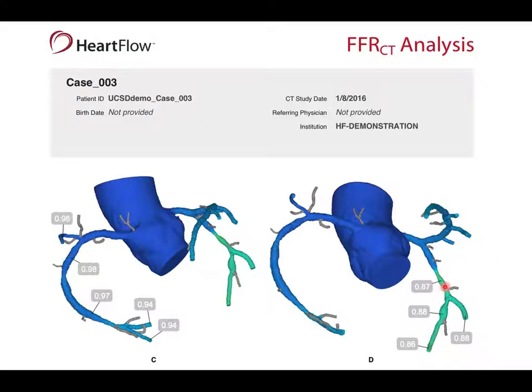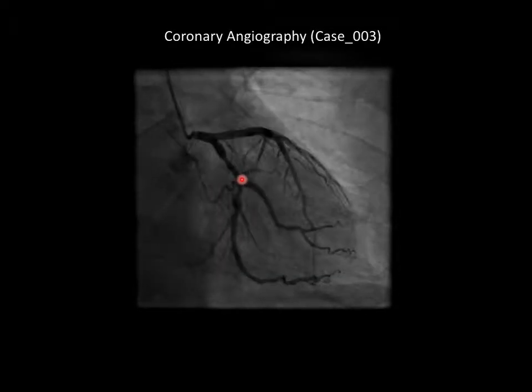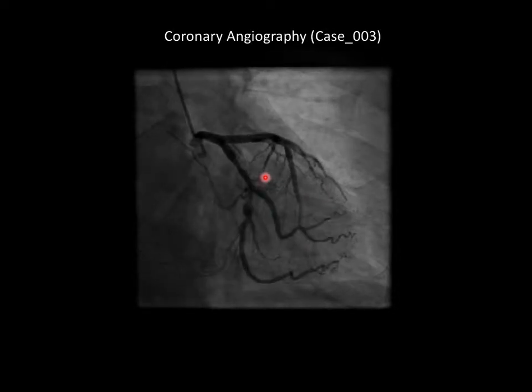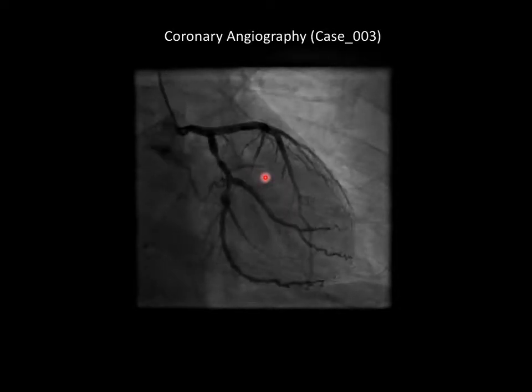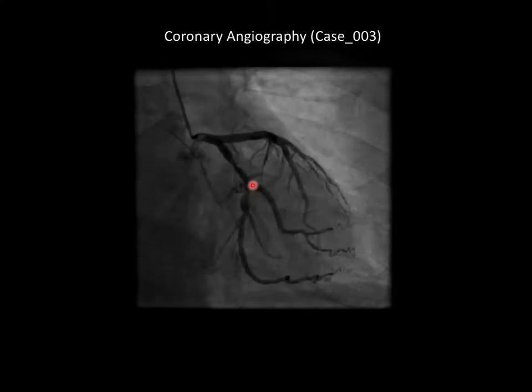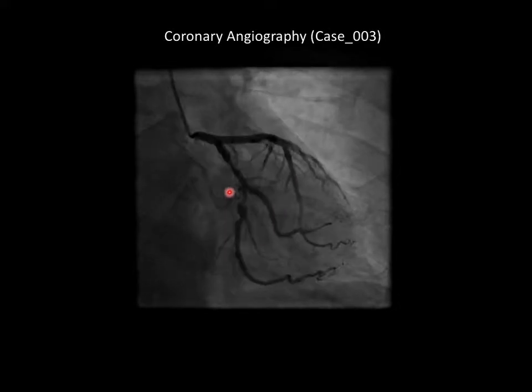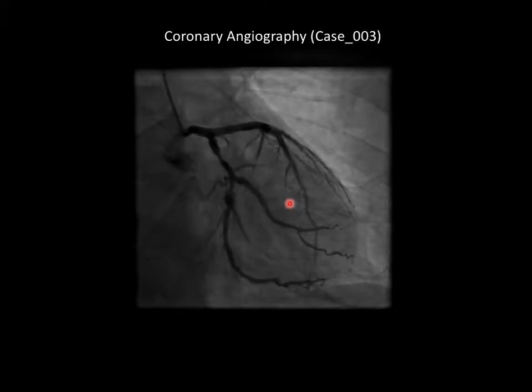And that patient went to the cath lab. They imaged them and saw this stenosis here, but they indeed measured the FFR and did not put a stent in. So the question is, should that patient have even gone to the cath lab? Probably not, right? Because when they look at it, they just would leave that thing alone and give them optimal drug therapy. Granted, you did discover that there's this kind of aneurysm down there, but that also can be seen on the CT.